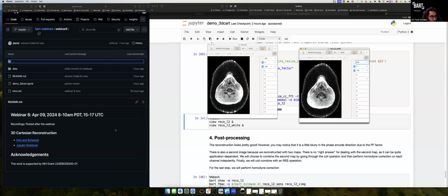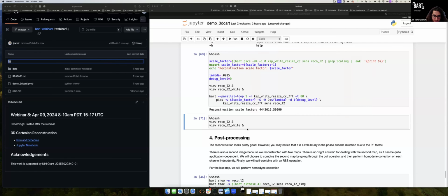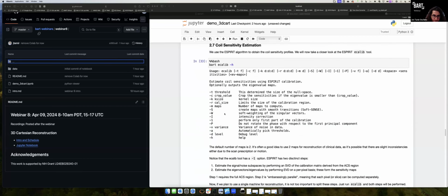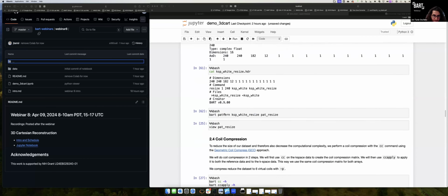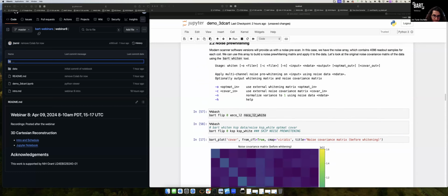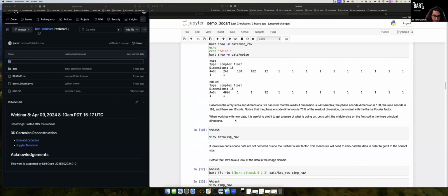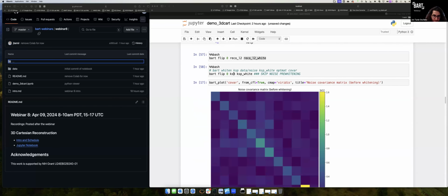All right. Anything else that you want to see or demo or questions? I'm just going to go back and undo my erasing of the whitening so that I don't forget.